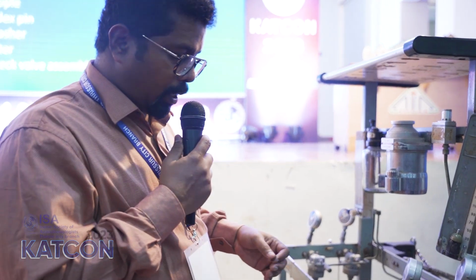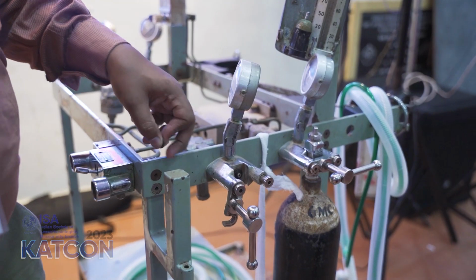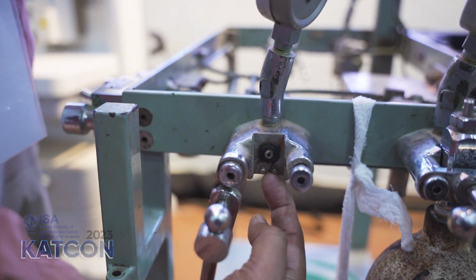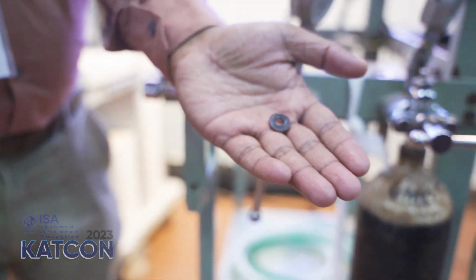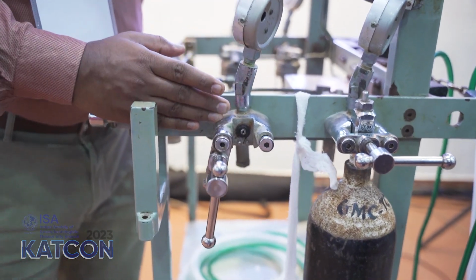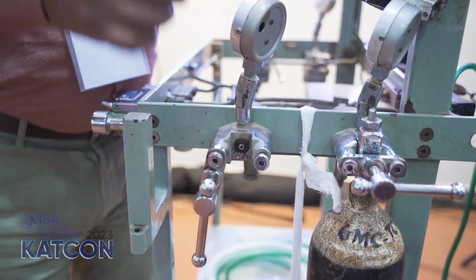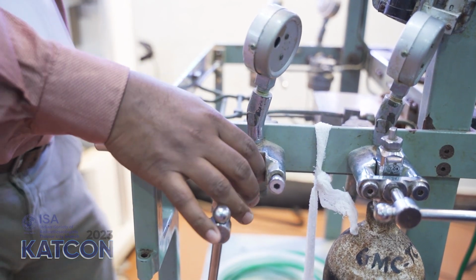Over to Sunil. So I think you can appreciate this hanger yoke assembly. I have removed the cylinder from one side. So you can see the swivel gate, the retaining screw, and you can see the nipple and the pin index system pins for the oxygen. And here inside, this is the Bodok seal I have kept out so that you can see. Inside this hanger yoke assembly, there is a one-way check valve, because if you remove a cylinder or a yoke block from here, even if the other cylinder is open, it should not leak through this side. But sometimes there may be some leaks, so to prevent that you have to keep a yoke block.